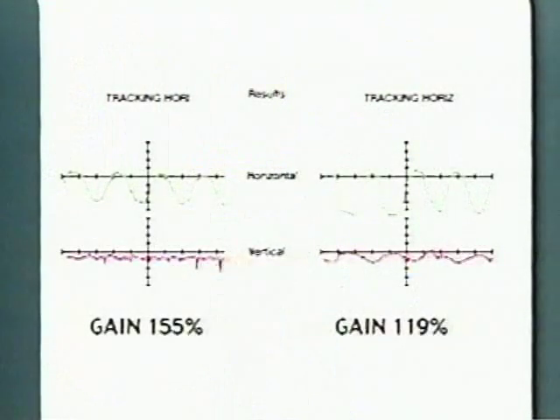Additional examples of tracking or pursuit abnormalities are also presented, the first two of which demonstrate, as previously noted, the cogwheeling type abnormality, which demonstrates abnormal morphology, as well as in the first case an increased gain greater than 140%, which is abnormal.